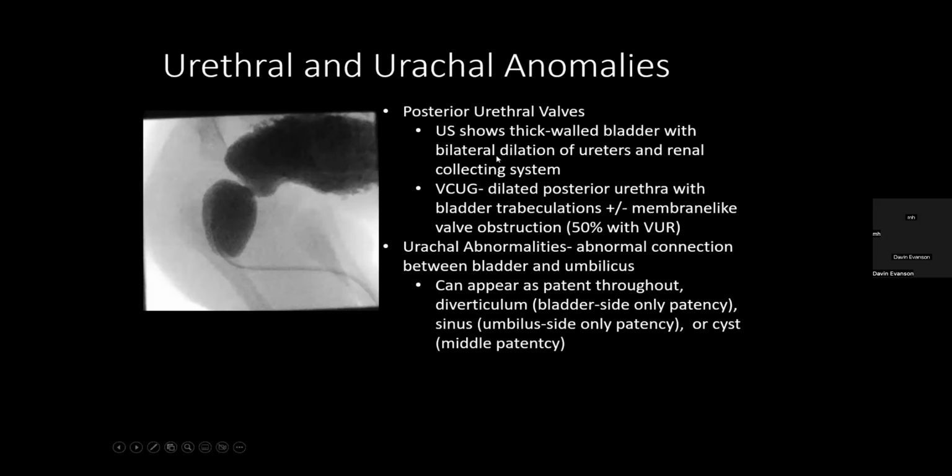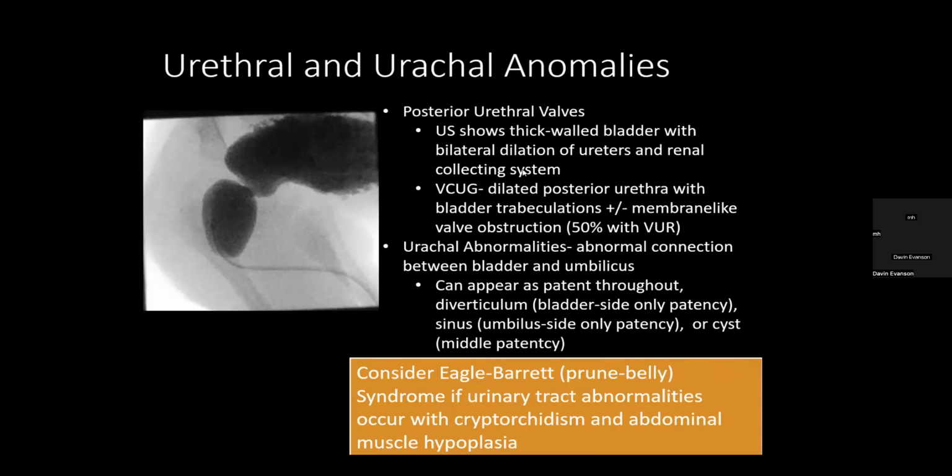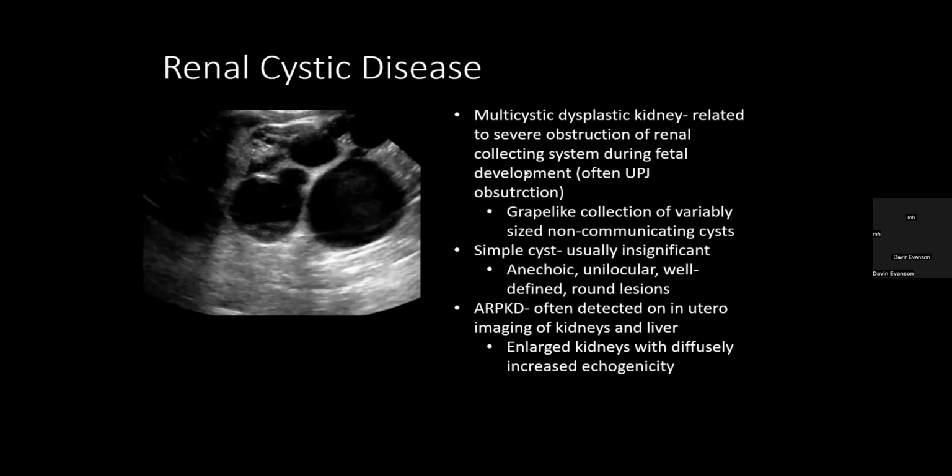Posterior urethral valves, some in the young boys we worry about, where there's a functional obstruction. So thick-walled bladder, dilated ureters, and the renal collecting system. Renal cystic disease, so something called the multicystic dysplastic kidney.